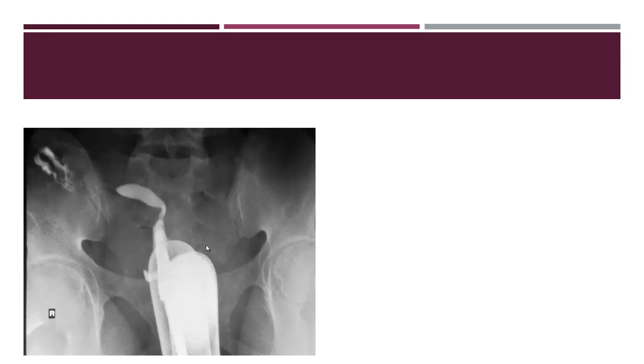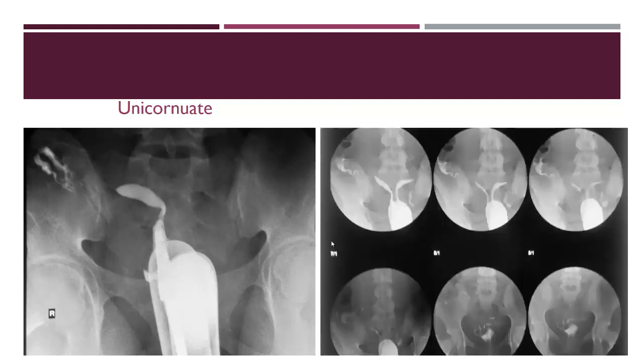Again, this is abnormal uterine contour. It's a banana-like shaped appearance of the uterus, but in this case, take care that the uterus is not pulled by the tenaculum. Second, take care that it is not one orifice of a second orifice of uterus didelphys. So this is unicornuate uterus, but you must take care that there is no other one.